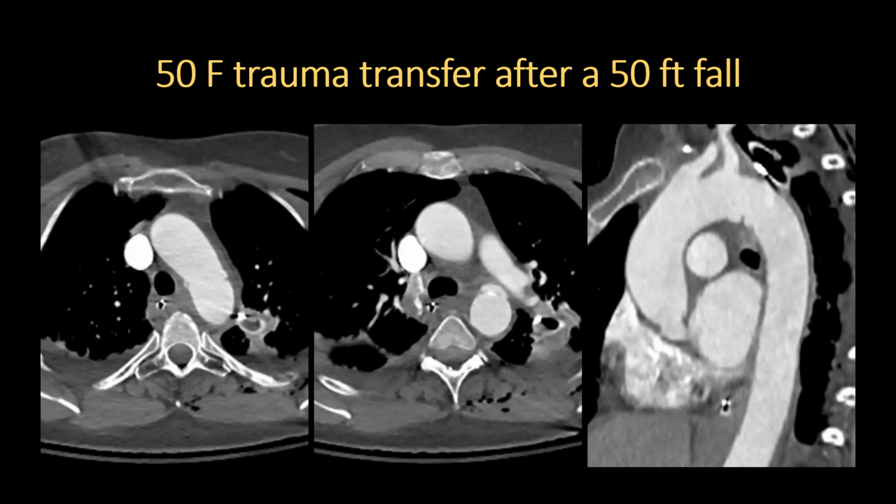This was a 50-year-old female who presented after a 50-foot fall. There is some controversy over whether this external contour abnormality was a ductus bump or a traumatic pseudoaneurysm. Note the irregular margins and greater than 180-degree involvement of the aortic diameter. Also, there are two irregular bulges along the lesser curvature of the arch. We have not seen a ductus variant that looks anything like this.